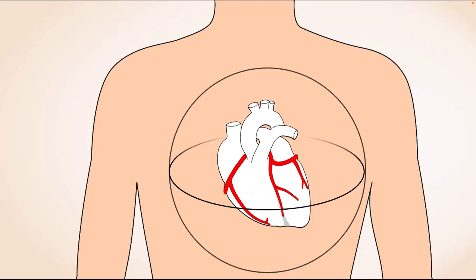The right coronary artery supplies the right ventricle, and its anterior wall is detected only by lead V1. But its acute marginal branch supplies the inferior wall of the heart. An inferior wall ischemia is detected by leads 2, 3, and AVF.